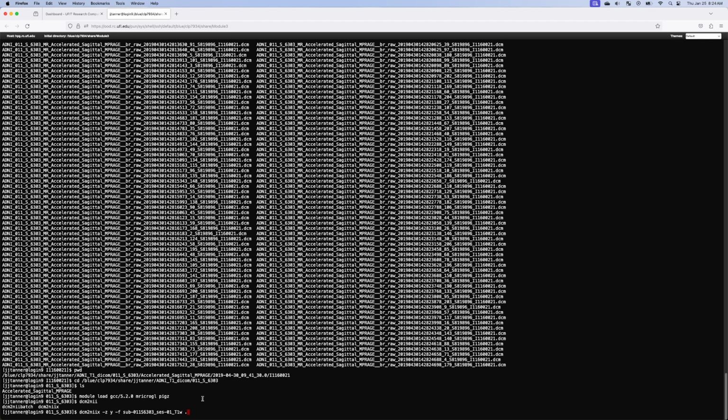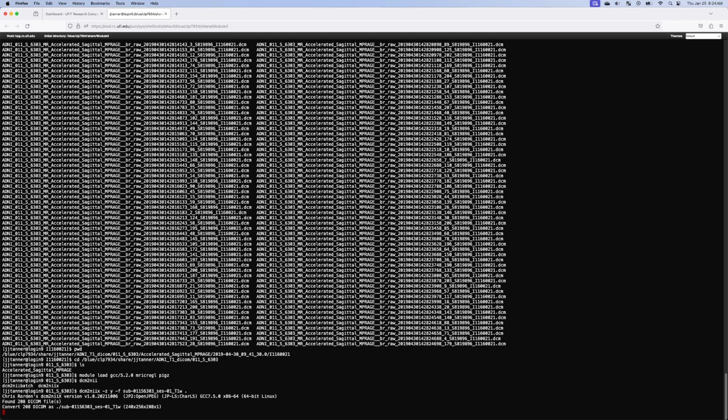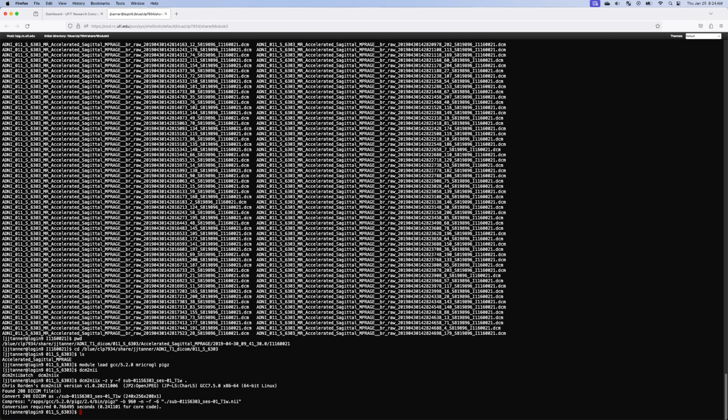And there's a lot of options with the software. You can actually change the defaults, or you can change a naming and have it make sense. But I typically use the defaults and just let it name. But in this case, because we're trying to get into a BIDS-esque format, we can give it a BIDS naming convention. And because there's just the one scan, I push enter, return, and it's done. It takes less than a second in this case because it's just one scan to do.